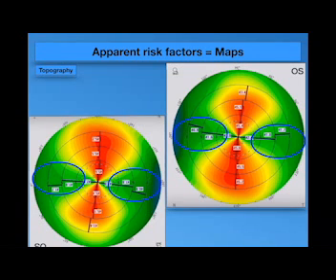explaining that. You may have a point with very steep K, but it will be explained clinically on the slit lamp by a scar in this cornea. So if you can explain this point, you may go further in studying the other parts, okay? But if you don't have any corneal scars or corneal thinning in this cornea, you will consider this an abnormal steepening in this part of the cornea, especially if you have this steepening in the inferior part of the cornea.